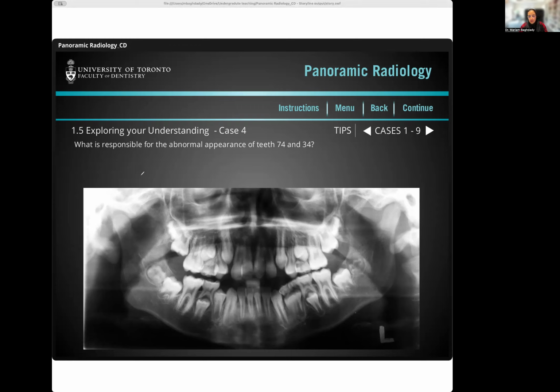Okay, so here is quadrant 5, right? 6, 7, and look at my 8, you guys. Wow, I don't even know what that is. Okay, that's my mouse. All right, so the question is 7-4.